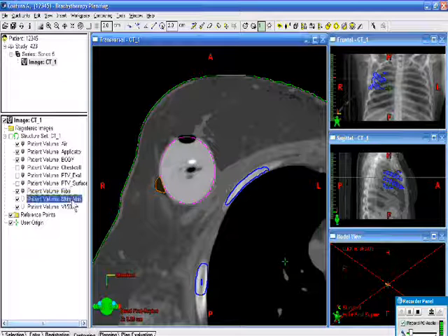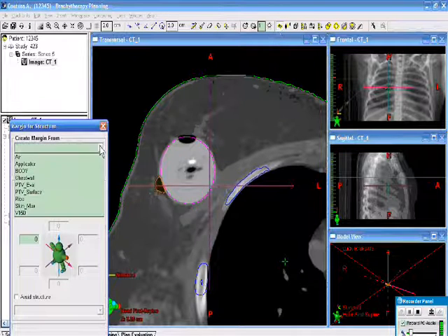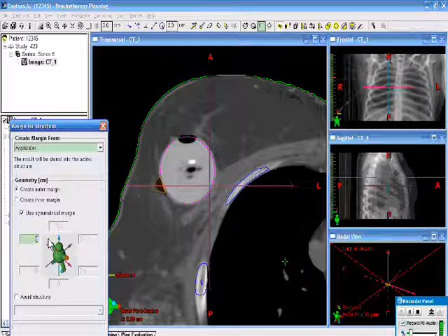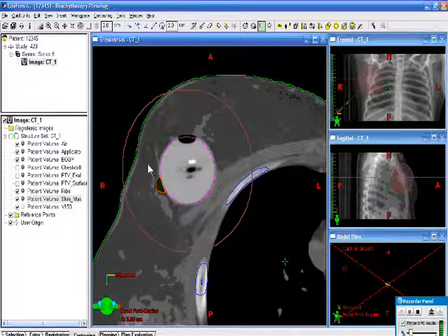So let's try that. And I call that skin max. So I tell myself that this is only for evaluation of the maximum dose. This is not the skin. This is a separate structure. So we're going to do that. The margining tool again. We'll margin from the applicator. This time we'll use a 3 centimeter margin and no avoidances. Structure here that extends outside the body.